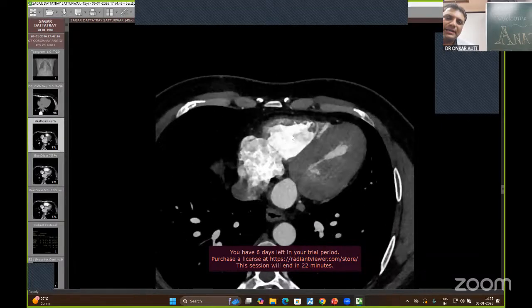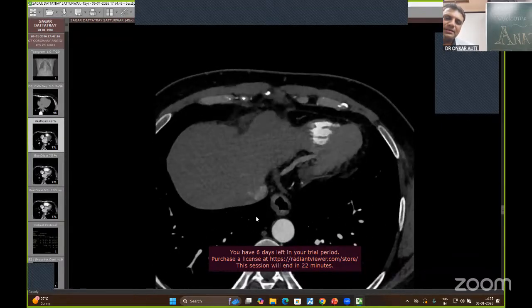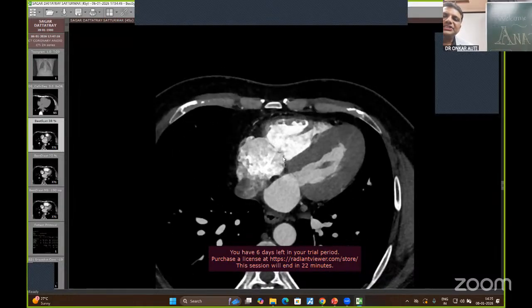Okay, if you follow that right atrium inferiorly, then you will see the IVC over here. And this right atrium is connected to which chamber of the heart? Right ventricle. So this is the right ventricle. You can see the position of this right ventricle, which is anterior. When you hold the heart specimen in the anatomical position adjacent to the dissection table, you see the right ventricle anteriorly and left ventricle posteriorly. Similarly, here the right ventricle is anterior, the left ventricle is posterior and to the left of that, and the posterior-most chamber is your left atrium.